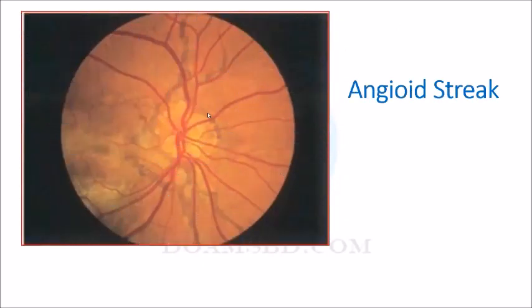This is my collection from the net. I am astonished really. Like Farial and other colleagues, when I was preparing, I saw this angioid streak in the question bundle. You can remember in the exam there is a picture. It was actually confusing me before because there were some white areas, and these marks were very faintly visible. So I was confused: which one is the angioid streak, the white area or that area? But after discovering this one, it was very clear to me. This is angioid streak.